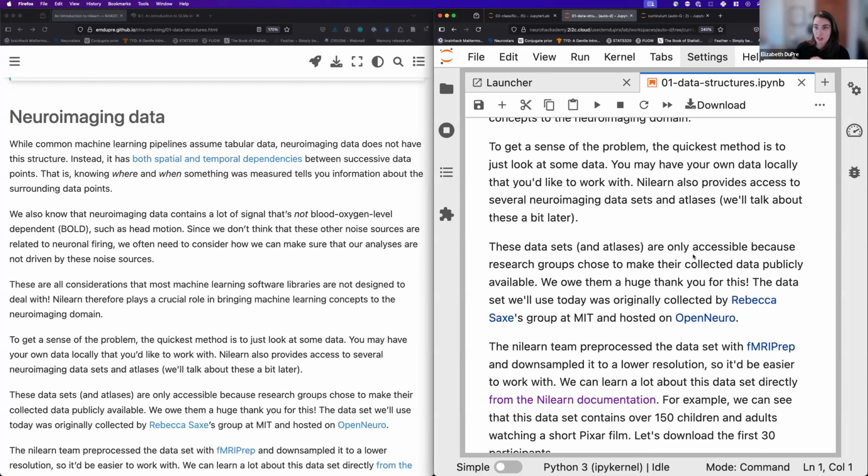And just earlier, Ariel was talking about data set showcases. I think the Nilearn ones make really nice, quick and handy things. I'll say that they're chosen specifically for the examples to make the examples run. So they're not necessarily the most robust depending on your particular question. Like a lot of the data sets are downsampled, for example, to 3mm isotropic resolution, just so that they run a little bit faster in the examples. But they're there, and I think they're really useful to quickly prototype things.